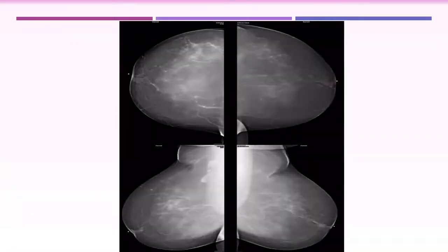And here, bilateral, mild, you even have residual fibrotic ducts. These are fibrotic ducts seen on ultrasound with subsequent mild subtle ductectasia and subtle skin thickening. What about these lesions? What about these retractions? Are you confident to say this is just sequelae of ductectasia? You might say yes or no.